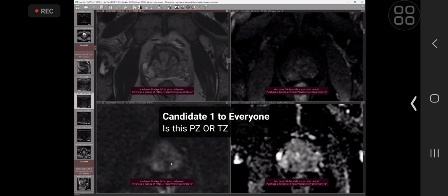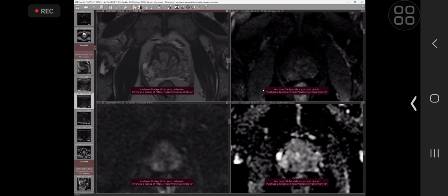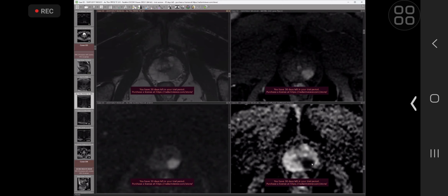There's a small lesion up here which has focal restricted diffusion and early enhancement at DCE. That would certainly only be a PIRADS 4 based on size. They were both tumors on targeted biopsy, and prostate cancer is often multifocal. If you look at surgical series, and yes, there's a selection bias when it comes to surgery patients, but in surgical series, 83% of patients have at least 2 tumors. They have a dominant lesion and at least one secondary smaller lesion. So prostate cancer is often multifocal. But the key thing is the index lesion, we call it the dominant lesion. That's the one to identify and to be sure about. But yes, be aware of satisfaction of search.